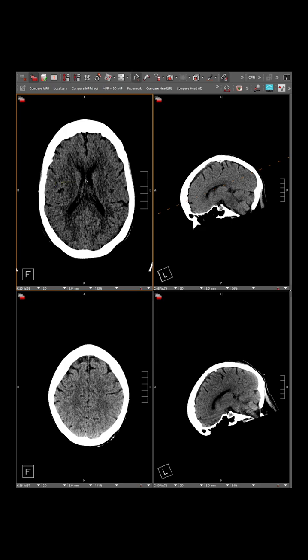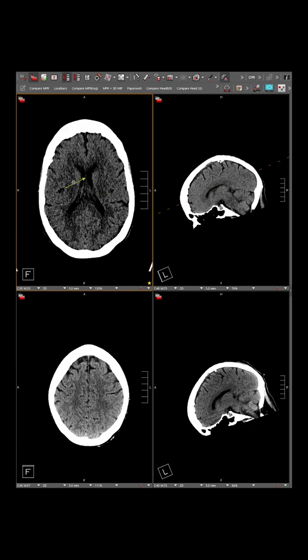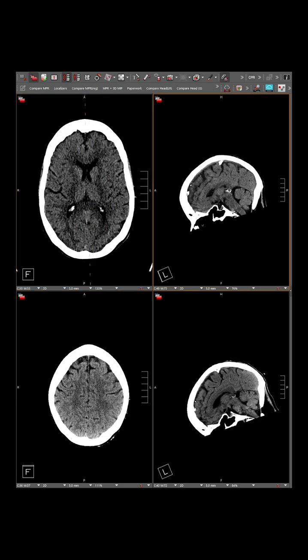But there's also a hotkey. I think it's default to T, either that or I've changed it to T, where you just press T and then you draw the arrow and the annotation pops up automatically. Another key thing you'll need to be able to do is to take ROI. I think the default is E for an elliptical one, and especially when you're doing PET, it's useful to create a 3D ROI. I don't know if there's a default key for that, but you could set it.